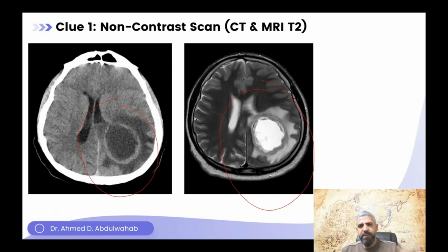What do we see? On the left side, the CT scan, there is some hypodense lesion, while on the right side, on the MRI, it's very bright. This is a T2 axial image, okay? First of all, what kind of edema is this? Is it in the gray matter or white matter or both? And do you know which pattern this is? It's from our previous lecture on brain edema. Excellent. The first thing, this is a vasogenic edema. Why is it vasogenic edema? As we said, because it involves the white matter, stops at the gray matter, and it is finger-like. You can see it's finger-like.